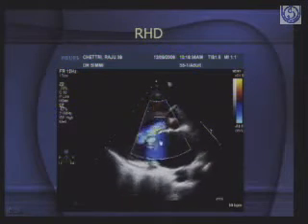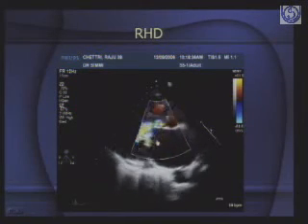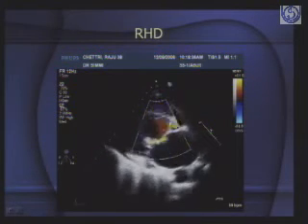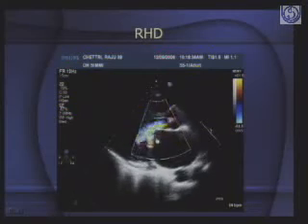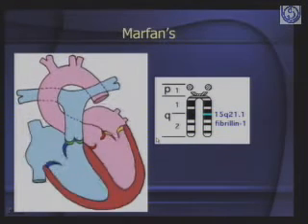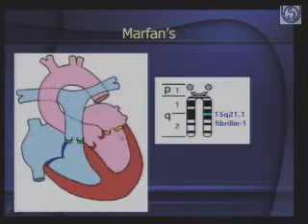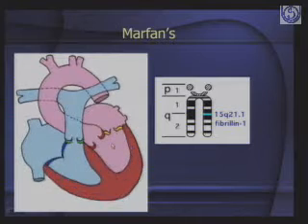So there must be mitral pathology as well, and you are seeing some bit of aortic mitral regurgitation. So the first and commonest etiology of aortic regurgitation in our country would be rheumatic heart disease. Then you look at Marfan syndrome. Why is Marfan's important? Because Marfan syndrome will give rise to mitral valve prolapse and will also give rise to aortic root dilatation and aortic regurgitation.